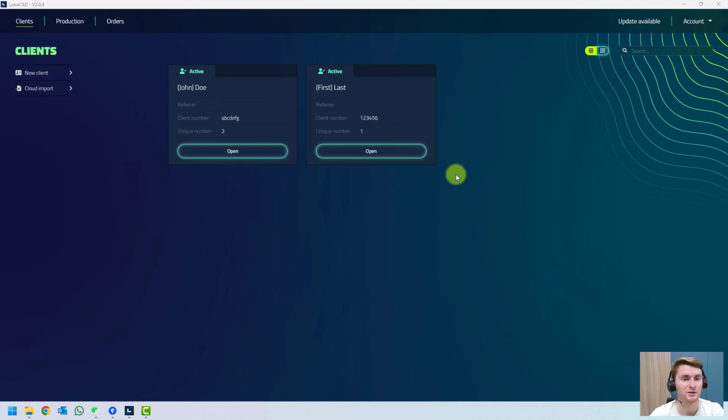If you open the software, this is the first view you will see. This is the manager. In the center we have our customers. On the left we have our options, and on the top right, we can search our customers. So the first thing you would like to do is create a new client.